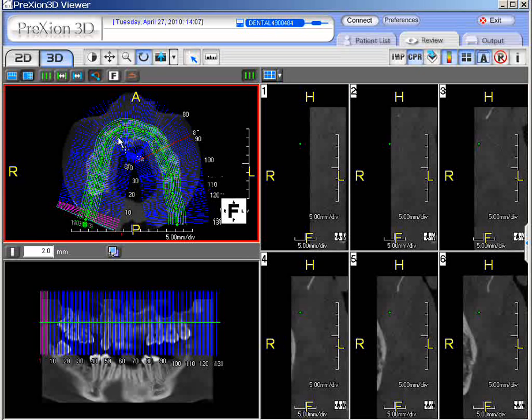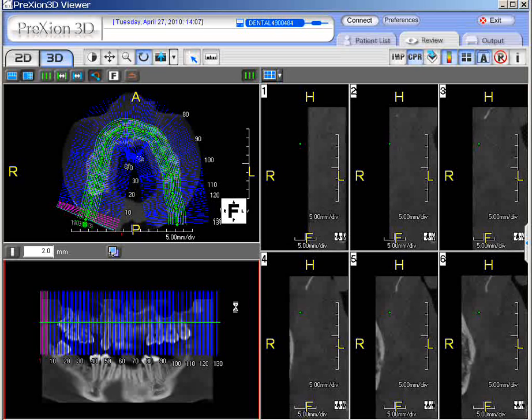Never scroll. Once you've selected it here, don't scroll the wheel in this frame at all. But come down into the pano image, come away from the blue lines, and notice the center green line is always in the middle between 1 through 11. Now if you want to change that, it's going to apply it to the panoramic image. So hold your arrow here, just gently scroll.